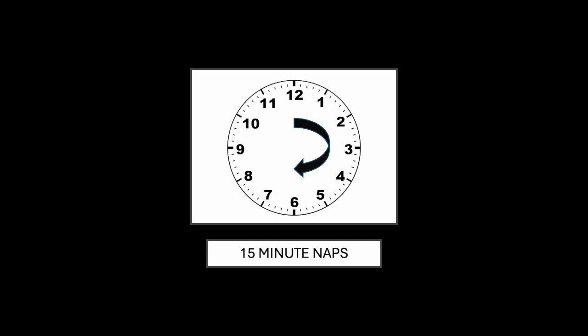It's going clockwise. Now, if we sample at half the frequency, where the frequency at which it goes around is 60 minutes, and we start taking 30-minute naps, that's where things get a little confusing. If we take a 30-minute nap, we go from the 12, and then we look at it and see the 6, and then we look at it and see the 12. Again, if we've never seen a clock before, we don't have any understanding of the direction in which things are going. It doesn't look like it's moving in a particular direction.